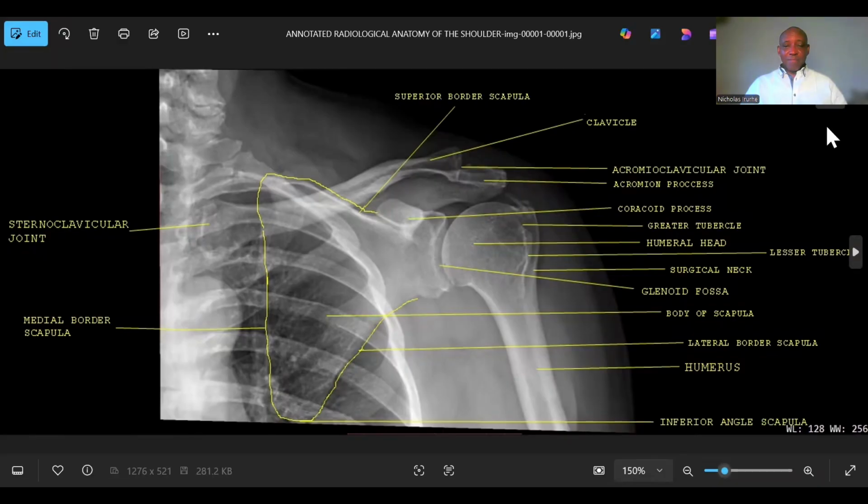The basic thing here is for us to teach anatomy using X-ray. This is not to make anyone a radiologist, but it makes teaching anatomy easier.